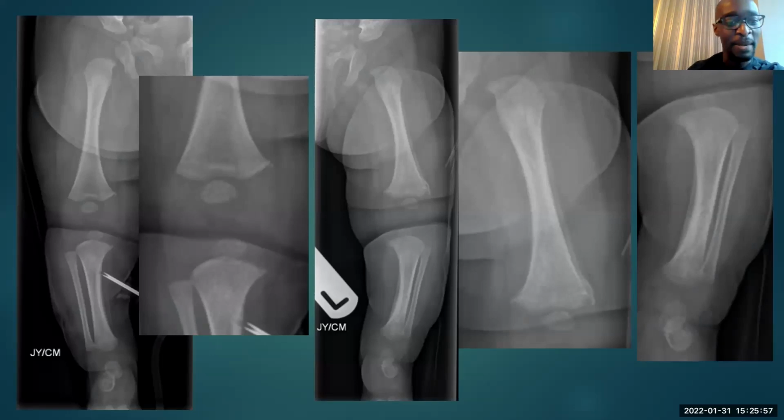Now then, what about the legs? So this is a view of the whole leg. And actually, this was done with a slightly older protocol because things have evolved. And I'm going to signpost you to some documentation from the Royal College of Radiologists, which is the UK radiology body. And the guidelines are excellent. These are written by global experts. So again, I'm going to signpost you to that.